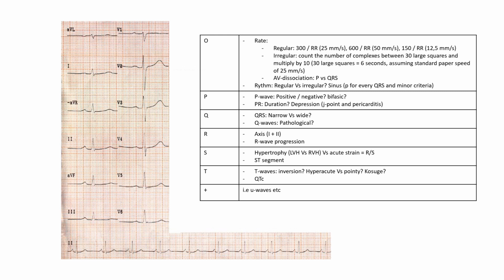All right, so if we use all of this when we go through the ECG, now I've shown a Cabrera ECG. Apologies for this. So, rate. How many small boxes are there here? Let's see, 1, 2, 3, 4, 5. So this is 25 millimeters per second. So 300 divided by 5 is 60. So this is a frequency of 60.